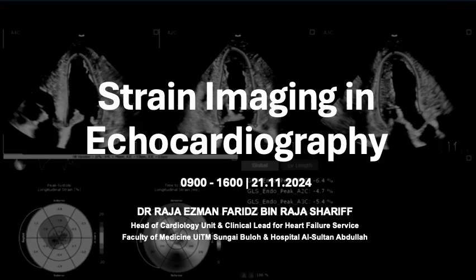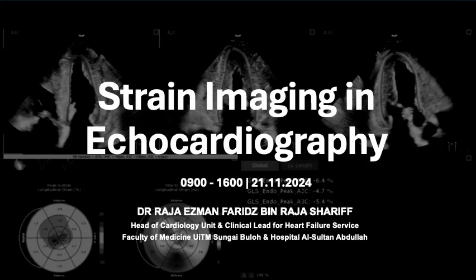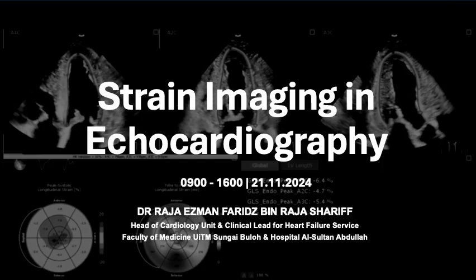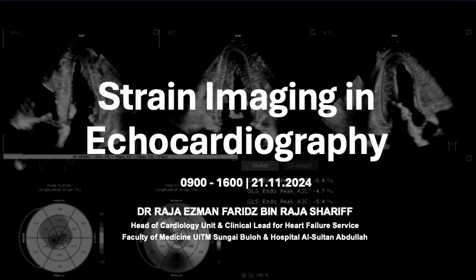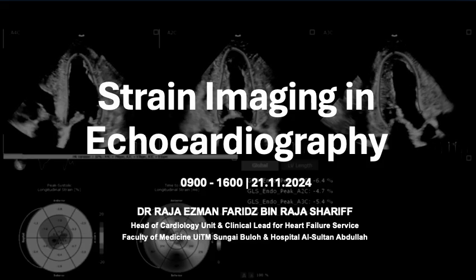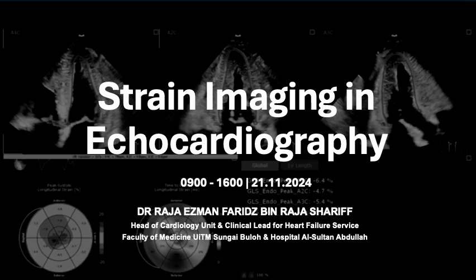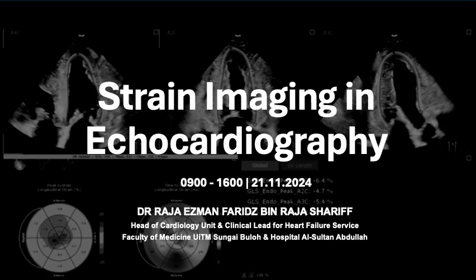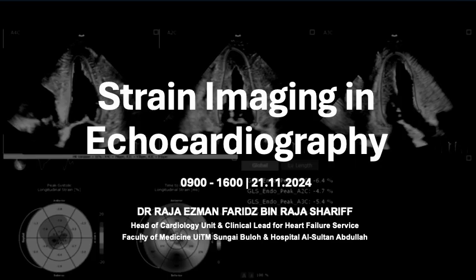Alright, so how many of you have done strain before? How many have you done echo before? Echo, you've all done, in my mind already. Strain, has anyone done before? No, okay. But have you heard of strain before? Yes, stress the cardio, stress the heart. No, strain, no need to stress the heart. Please, we don't have to stress the heart. But I think the most usual way people would talk about strain is this one, this bullseye plot.